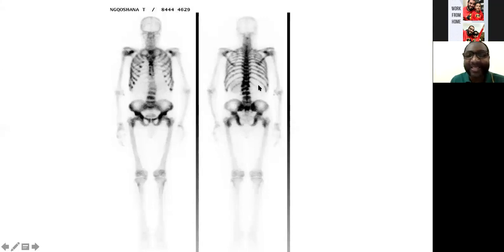Sure, thank you. And the kidney is not seen. And then, so what differentiates this from a metabolic bone disease?